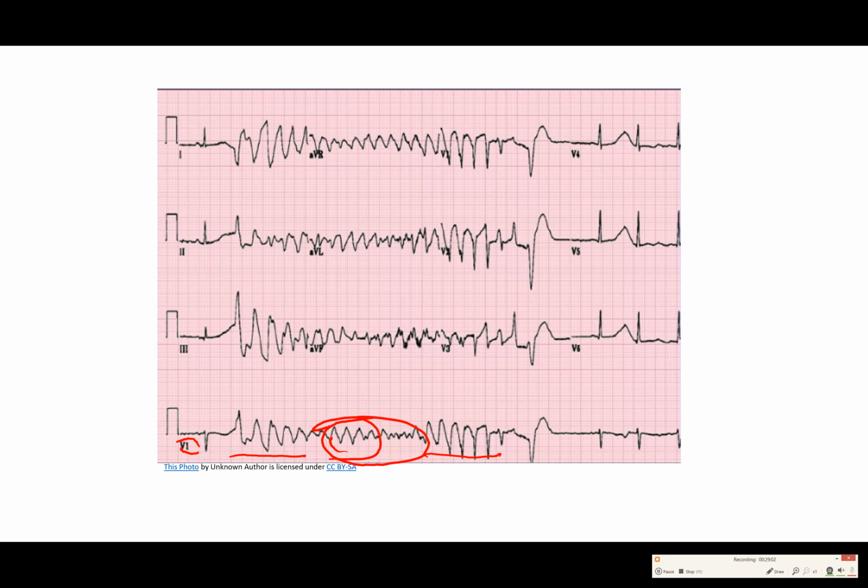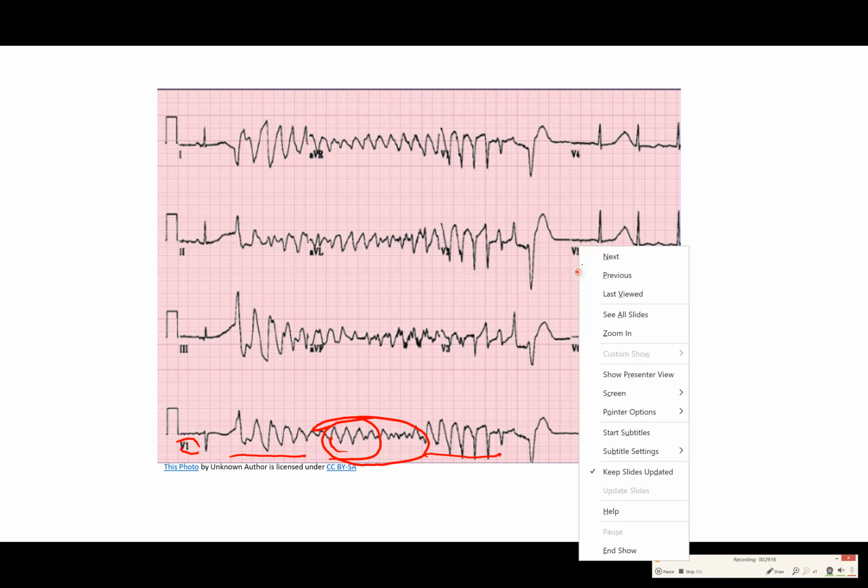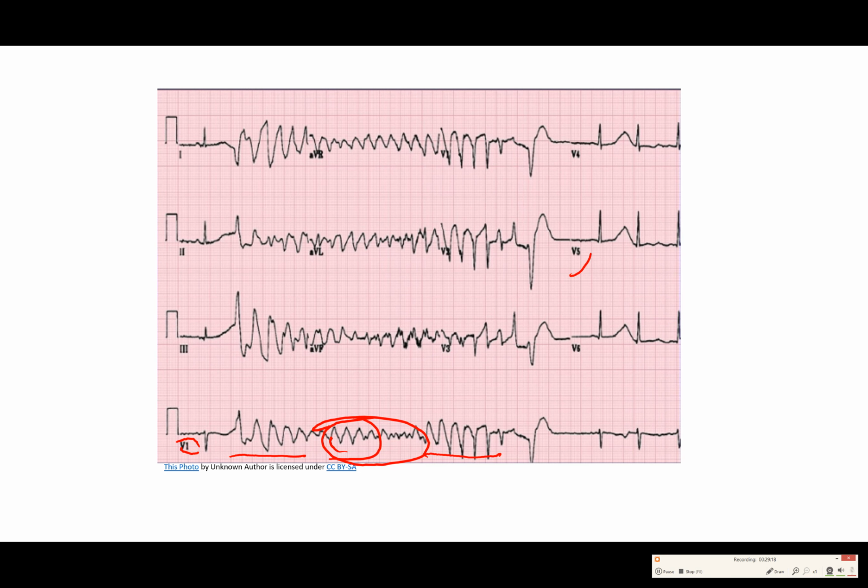When you see that, and of course you don't have the regular architecture, right? You don't have P waves, you don't have T waves, you don't have any of your intervals. You just got kind of that sawtooth pattern that starts tall, gets short, and then gets tall again. When you see that, that's torsades. Looks like my pen might want to work. There we go. Torsades de pointe. It's French, and you can look that up if you want to.